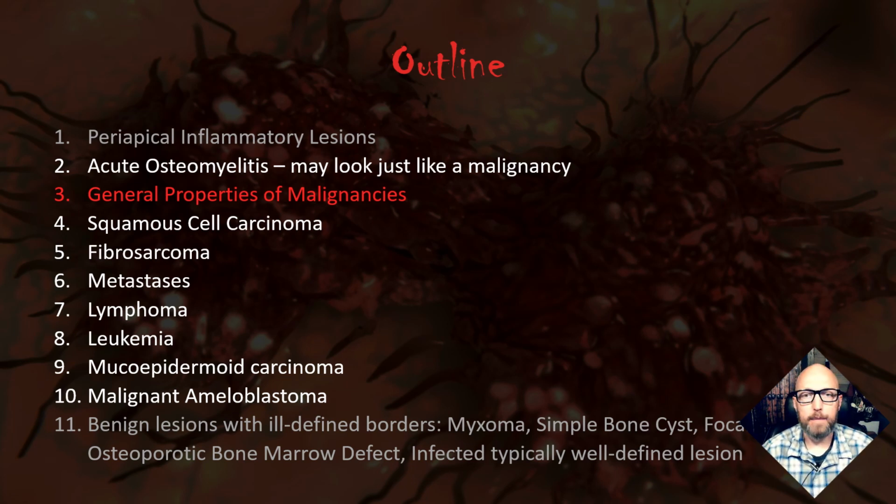And a lot of times it's difficult to distinguish what type of malignancy it is, and you won't know until you do the histopathology. And so mainly this is to help you distinguish when you should start thinking that something might be a malignancy, when it should raise red flags in your head, and definitely recommend prompt follow-up by the patient. Refer them to a surgeon if you're not comfortable doing a biopsy, but get that biopsy and the final diagnosis because you're worried that this could be a life-threatening situation.